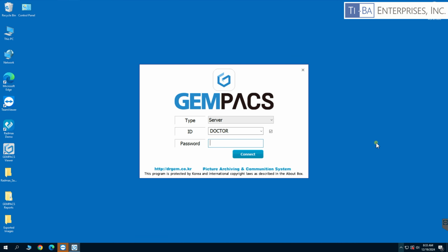In this video, we're going to be looking at GEMPACS archive software by DRGEM. If you have not already viewed them, we have companion videos for DRGEM's acquire software called RadMax on our website as well. So what we'll do to get started is we'll just log into the GEMPACS program.